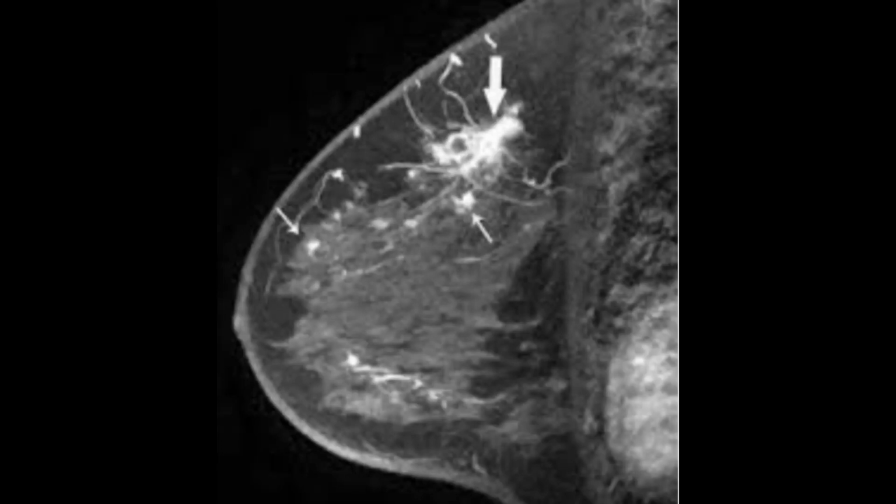But we do not recommend using ultrasonography to confirm the presence or absence of microcalcification. The only tool that you have is the mammogram, with two standard views, MLO and CC. Besides this you need extra or supplemental views, like magnification views and a true lateral view. This will help you to identify these calcifications in a correct way.